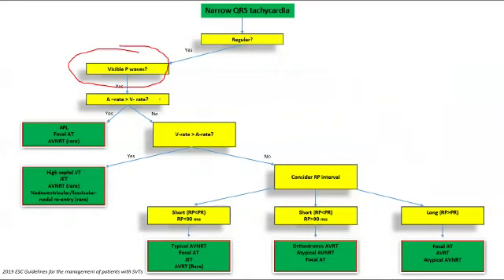But what if when we see the ECG, we have a narrow complex tachycardia, regular tachycardia, but we are unable to identify P waves? So as per the guidelines, it is said that if there are no visible P waves, then your differentials become these ones here. Could be typical AVNRT, because you have such a short RP time.